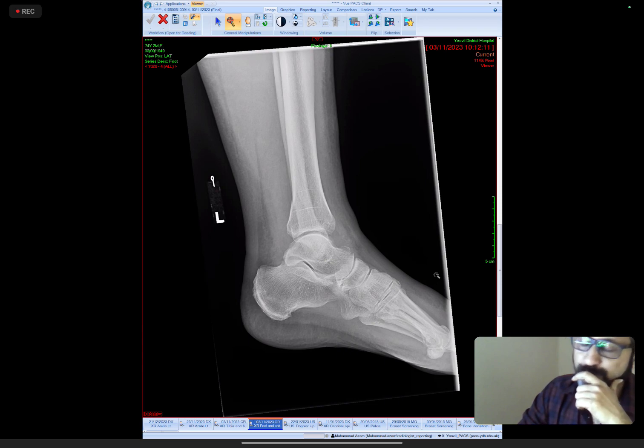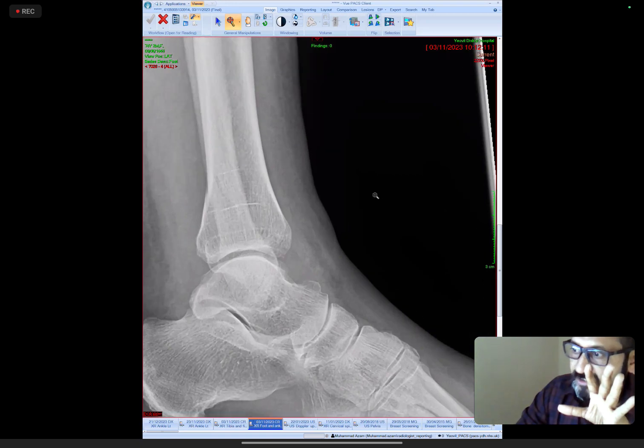Don't overcall means, if you see something, there is an obvious thing. And someone wrote here, I wish to enlarge. And yes, this is a good technique. First, go through this clearly and then try to enlarge.